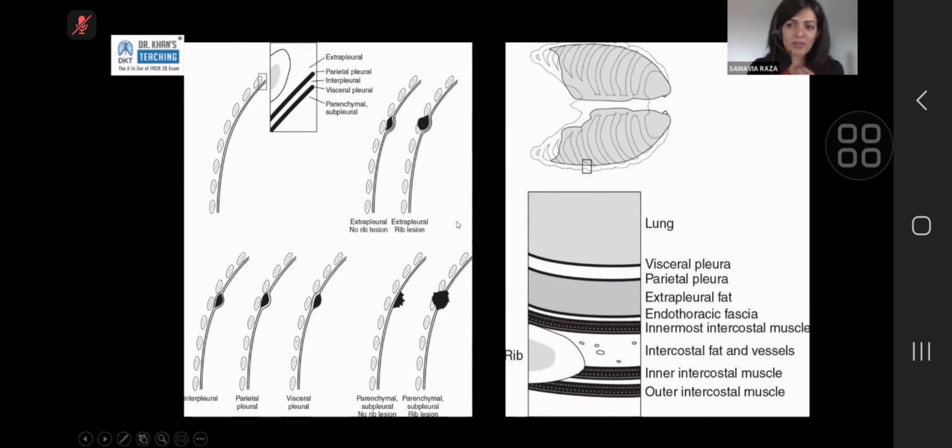And the answer is yes, but what grows from the visceral pleura and grows into the lung? Nothing. If the visceral pleura was growing something, it would be growing it in both directions. This is a lung lesion. It is an aggressive lesion. It is growing outwards. This technically could still be a visceral lesion, but it's clear that it is aggressive. An aggressive lesion, pleural malignancy is rarer. So the likelihood of that being a peripheral lung malignancy is much higher than being a pleural malignancy. So that alone, on the balance of probability, you would call it a lung lesion.